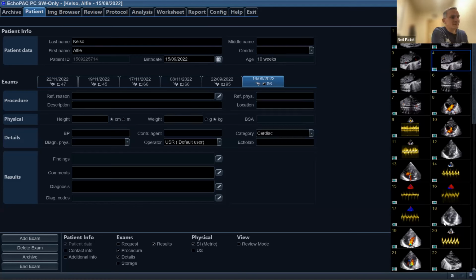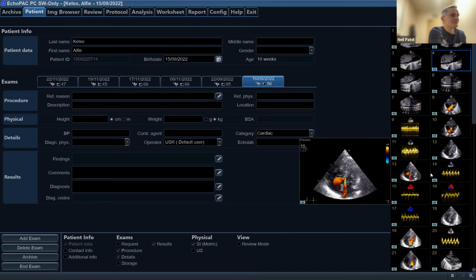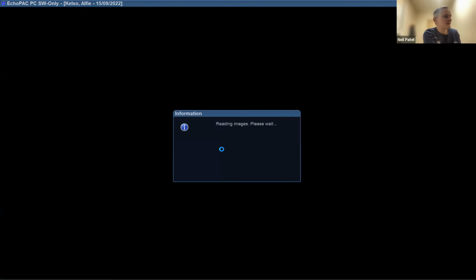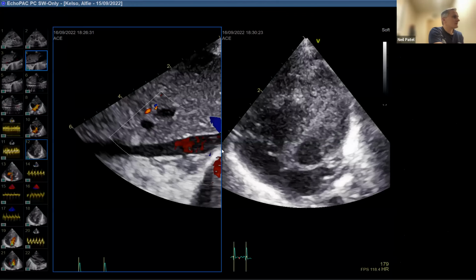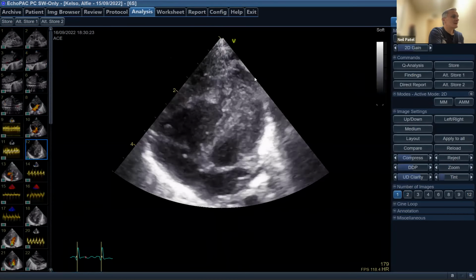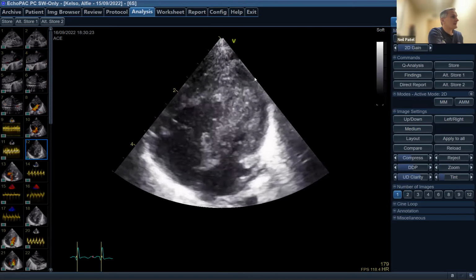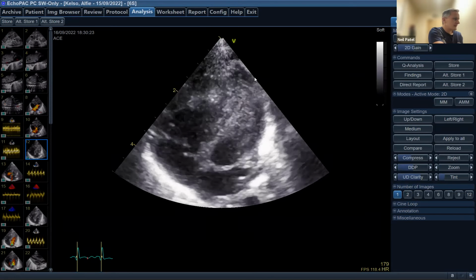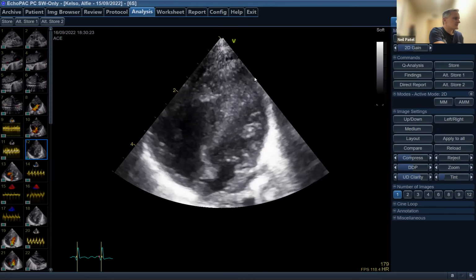Right. This is actually the baby that we discussed a few weeks ago. So I'm just going to use their echo because it's one that's of interest and useful. The clinical background is not so important, and we're not really going to be discussing that just now. But as a reminder, this was a baby who, in the first day of life, turned out to have severe sepsis.